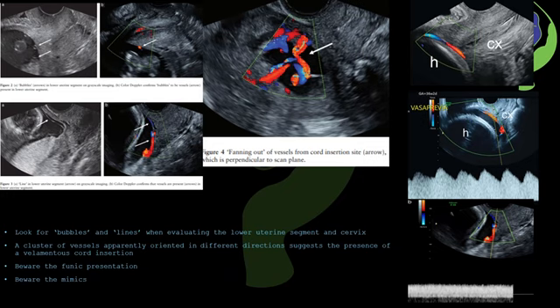When we suspect vasa previa and we sample the same blood vessel, if it turns out to be an arterial flow, then funic loop and maternal arterial blood vessel are the differential diagnosis. Now let's think about if it is a venous flow, then how do we differentiate?